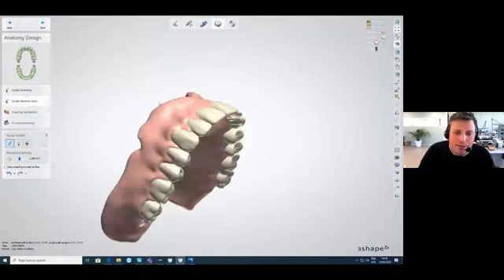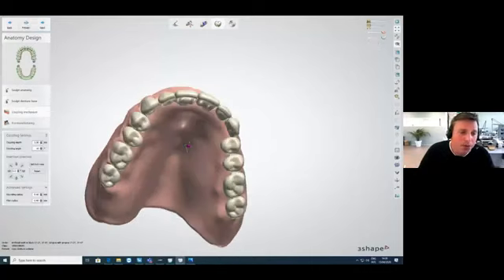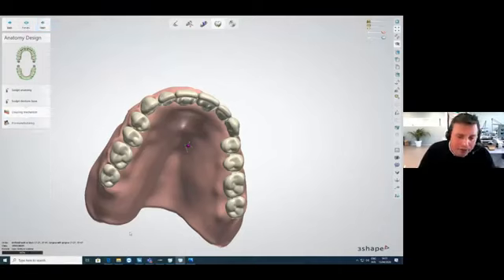And we hit the next button, and you go directly to the same step as with your normal denture, the coupling mechanism, and that will create a perfect arch on the basal side of the arch. That's easier to cut out in the gingiva part. And we have to wait a little bit for some calculation time. And you will see at the end, the software will generate two separate STL files.